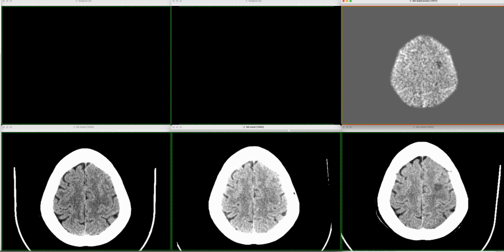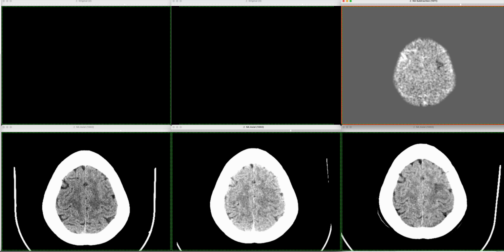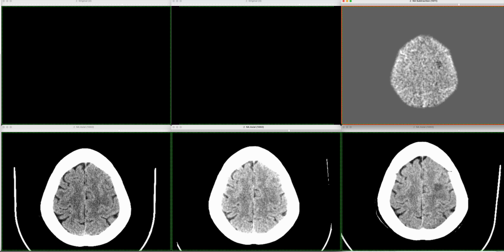extends posteriorly here, and on the admission film, that gyrus is truncated because there's been an infarct involving the gray matter such that it's isodense with the white matter. It doesn't really show up as an abnormality on here necessarily, but on a subtraction series, it's really evident. So this is just one example of the use of the subtraction series. It's very useful for complicated postoperative or post-traumatic cases with hemorrhage and subdurals, etc.